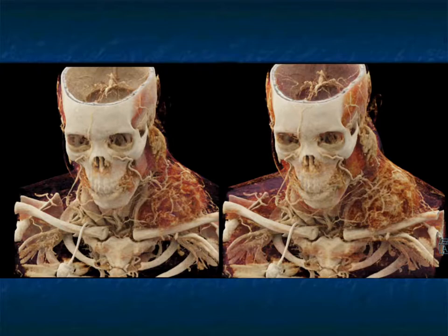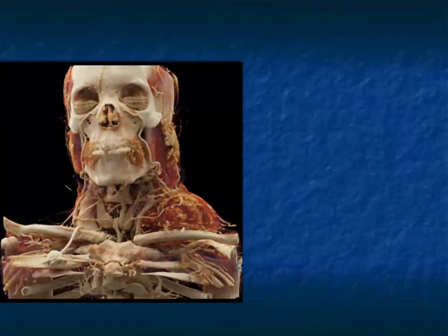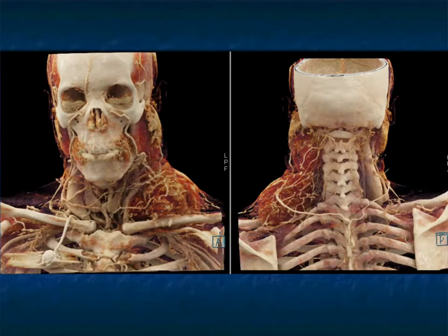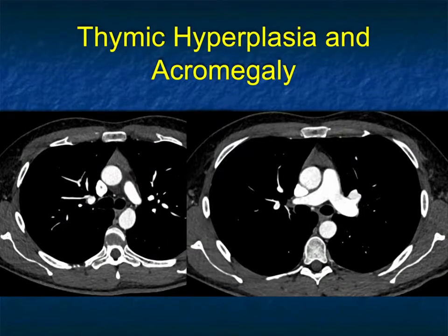Here you can see I'm looking in the top of the skull. You can see the circle of Willis. But again, the type of detail we're able to get. So again, just think about the imaging and what we're able to see, whether it's an anterior projection or a posterior projection. The interactivity becomes important, and you could send the referring clinician some videos or send static images.